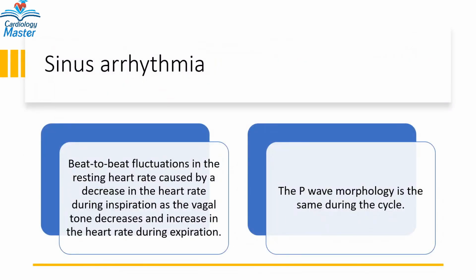What happened here is called sinus arrhythmia, which is described as a beat-to-beat fluctuation in the resting heart rate.